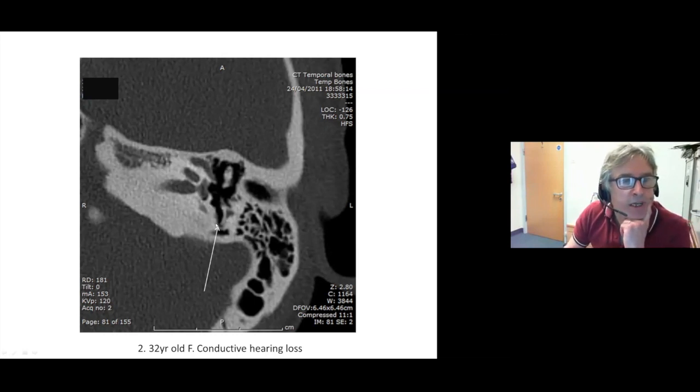And this structure here is a pretty deep sinus tympani. Here's our pyramidal eminence. Okay, facial nerve recess on the other side. This is quite a deep sinus tympani.